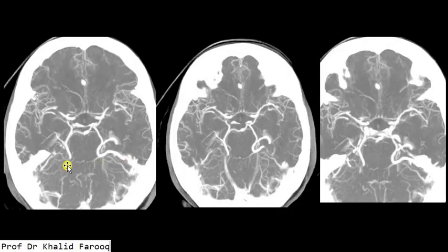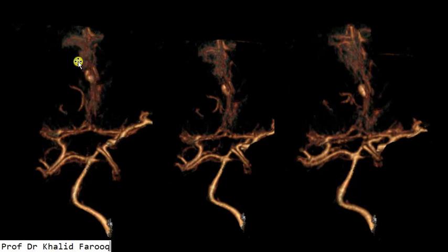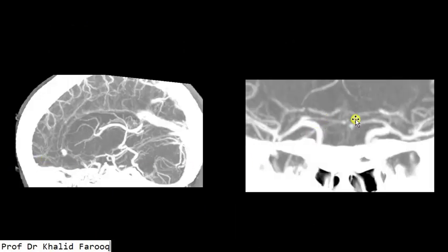Here we have her CT angio. We can see that there is severe luminal narrowing of both anterior cerebral arteries, which are barely visible, and we can see multiple collaterals are noted along the course of both anterior cerebral arteries on either side with a small aneurysm. Overall caliber of remaining vessels at the circle of Willis are relatively reduced as compared to the normal caliber usually noted in other angio cases of the brain.